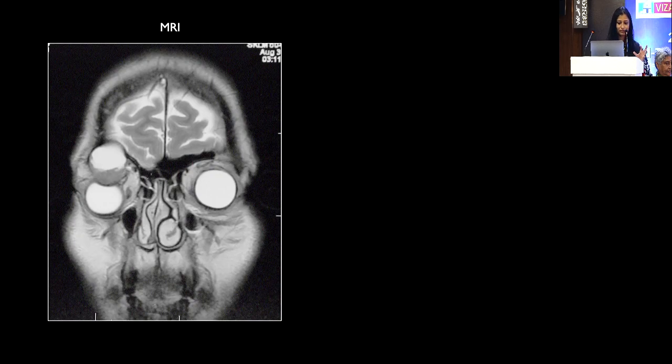On the other hand, there are certain cases where MRI may not be completely adequate. So here we have a patient who was a 45-year-old male presenting with a large mass in the superior and superotemporal right orbit. It seems to have progressively increased towards the cranial cavity.